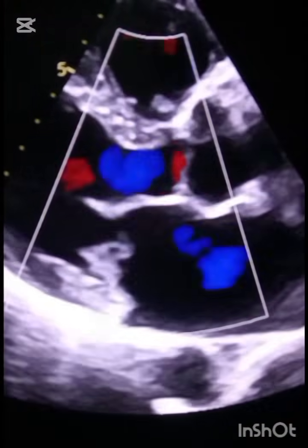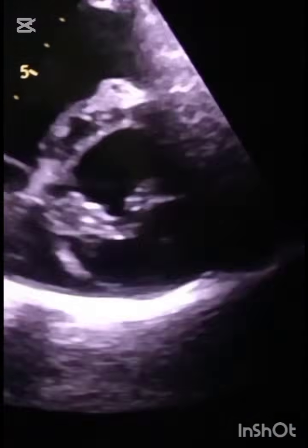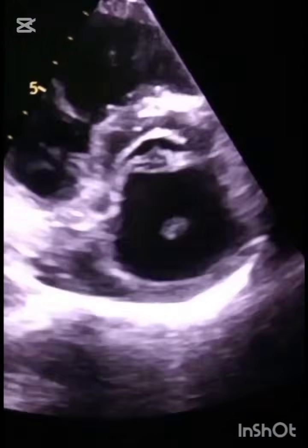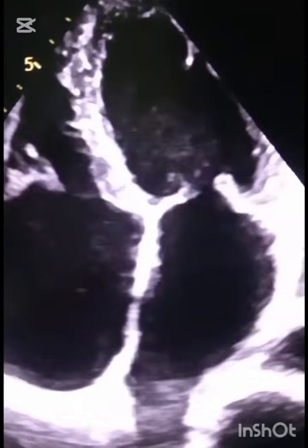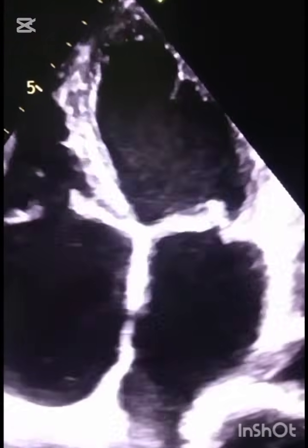Assessment of severity of MR on echocardiography. In addition to identifying the cause of MR, echocardiography is equally reliable in assessing the severity of MR. There are certain findings which are supportive of significant MR, while the severity of MR can also be assessed by semi-quantitative and quantitative methods. Supportive signs: LA size and LV size.